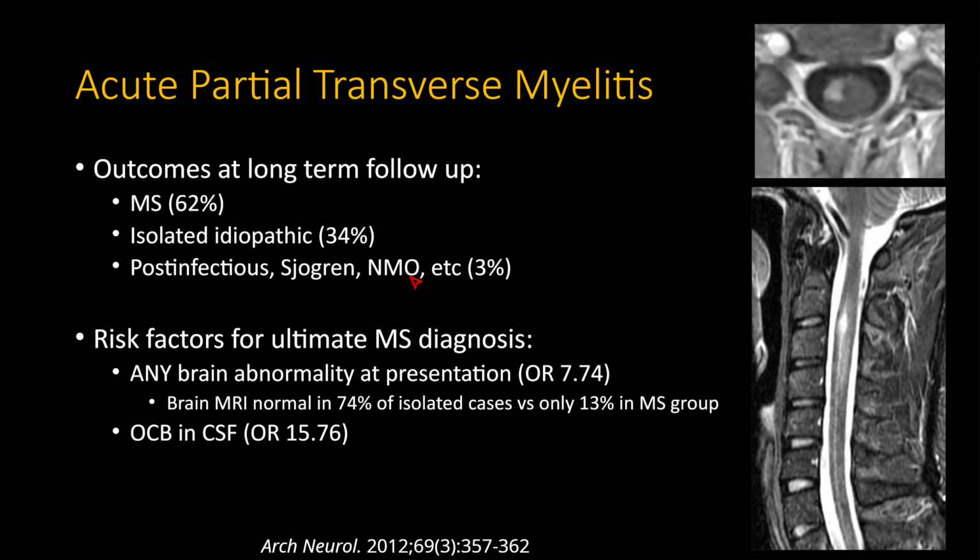And remember that this syndrome, the acute partial transverse myelitis, has a clinical component. Clinically, the symptoms also need to be unilateral or correspond to a unilateral aspect of the cord. Sometimes, if the symptoms are bilateral to the cord, but you only see on cord imaging a vague lesion in just one side of the cord, that doesn't count as partial transverse myelitis because clinically they have full transverse myelitis and you just happen to not see the entire aspect of the myelitis on imaging.